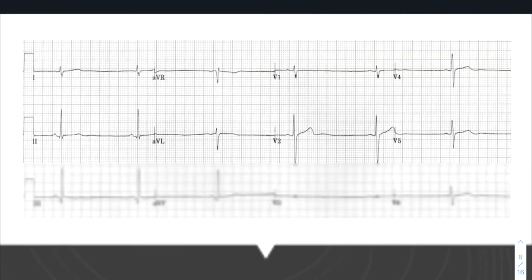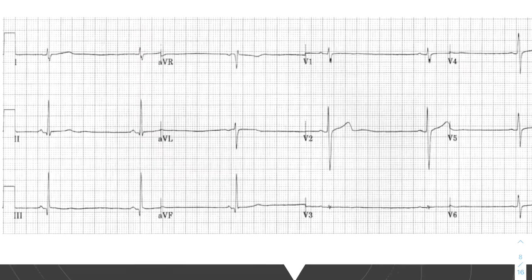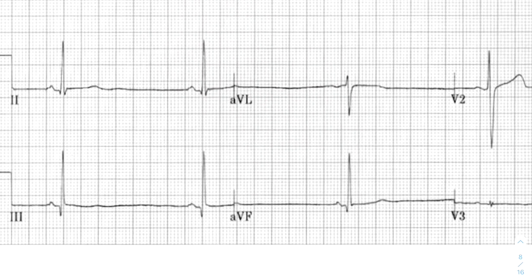Here's another example, again, just of an ECG that we're just going to go through. I'm just going to tell you that the rhythm here is regular, so we can use either the 300 method or the 10-second method, but the peaks are lined up so nicely, we'll just use the 300 method to determine this.